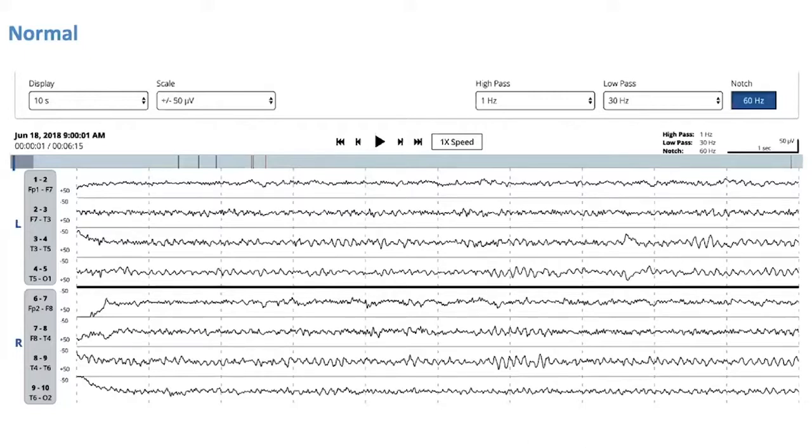And if you go to the left side of this, the third second from the end, you can see a change to the alpha rhythm. Maybe you can circle that, just to the left on the left side. Yeah, I was thinking of the second before that. And that change I consider normal, just noise also. And that's nothing of particular meaning because it's only present at the T5 electrode. Only channels that have T5 have it. And so probably something just knocked against the T5 electrode at that moment. And using that as an example of a change to the EEG that does not have a credible field.